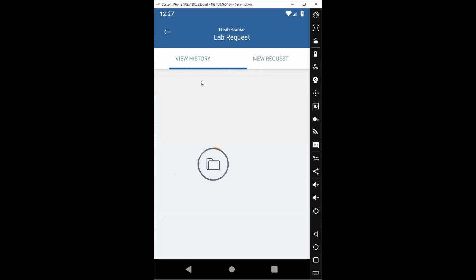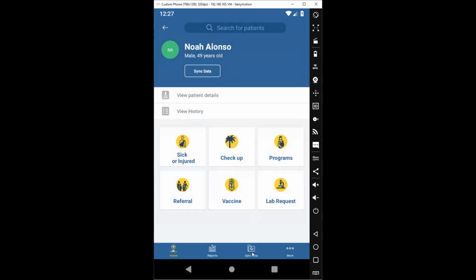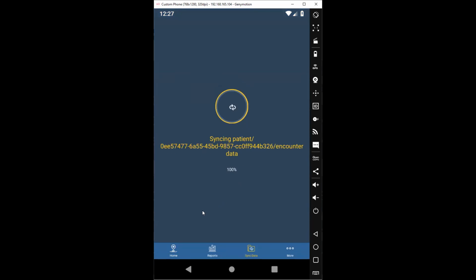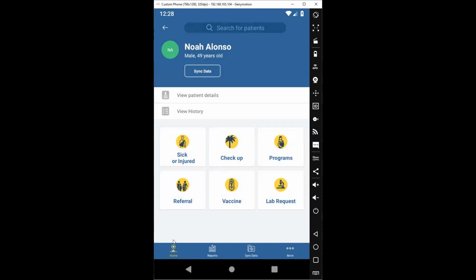And you submit that. So we're hoping that it's always fairly self-explanatory, that you're just filling in the most obvious answer in all cases. And as we say, always doing the same workflow. Okay, the third scenario, if you've done an RDT, is that the patient is positive, but they're asymptomatic or it's a low prevalence area. So you want to send it off for a confirmatory test.